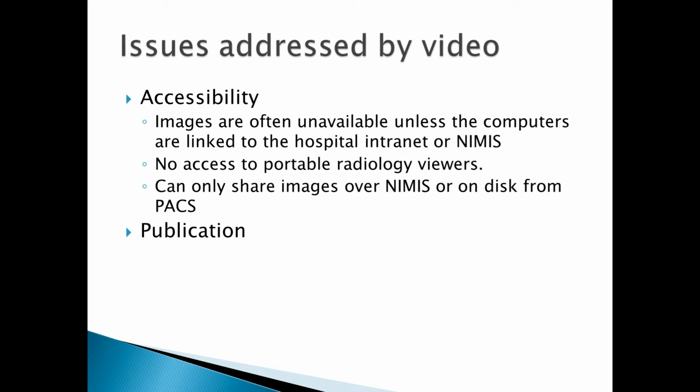I propose that electronic video is an ideal format for quickly and effectively diffusing cross-sectional and dynamic radiology. If we think about a CT, for example, it is a series of images, each slightly different than the last, presented in series. This is the same core concept that animates video. In the past, consuming images as video would be awkward and time-consuming, but with the ubiquity of computers, almost everyone now has ready access to a platform for creating and consuming digital video.